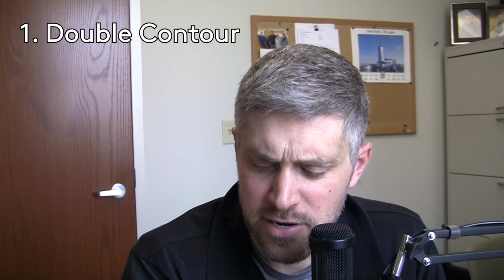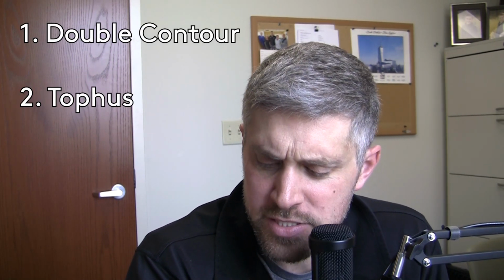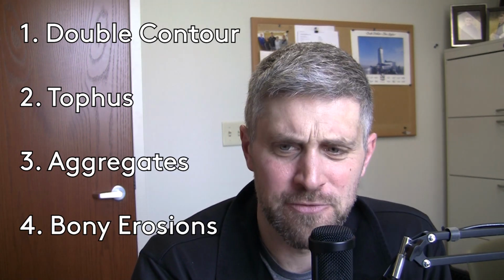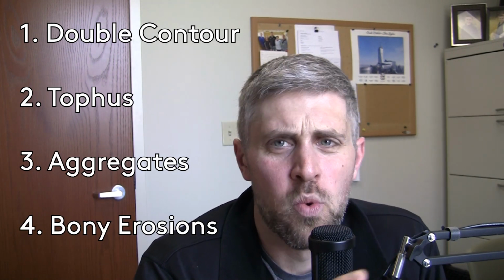But it's always that scratch-your-head moment: how do I deal with this? How do I figure this one out? So that was really good. I really enjoyed that summary at the beginning, not only of the clinical gout, but also the 4 signs. I wrote them down: the double contour sign, the tophus, the aggregates, and the bony erosions. If we take one take-home point, it's those 4 things that define the sonographic characteristics of gout.